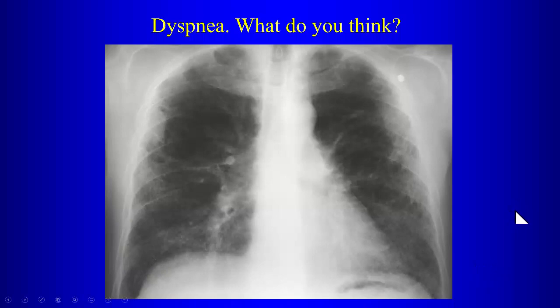Chronic shortness of breath with this chest X-ray appearance, you would be thinking about which one? We just spent 20 minutes talking about UIP. So would you consider UIP here? Absolutely, you should consider UIP. And if you're not considering UIP, I've just wasted the last 20 minutes with you guys. But, okay, what is your concern? My concern is, not a concern, it's just, I don't see them much in the bases, like you showed us. Well, do you agree there are reticular opacities here?